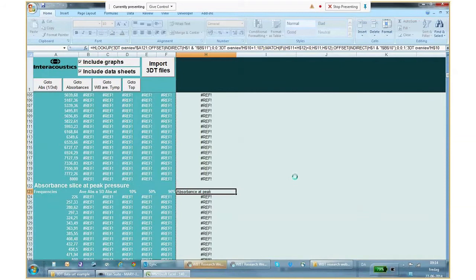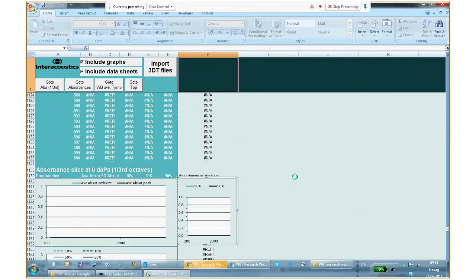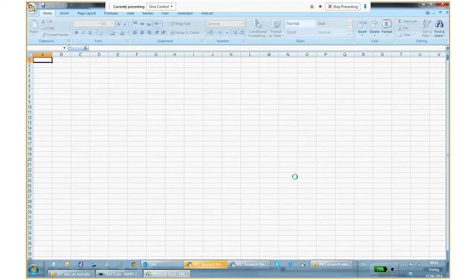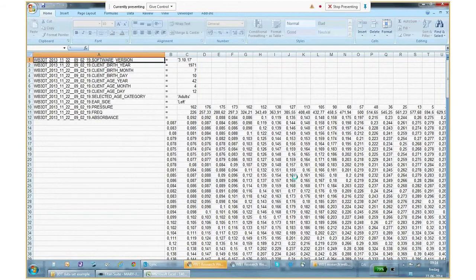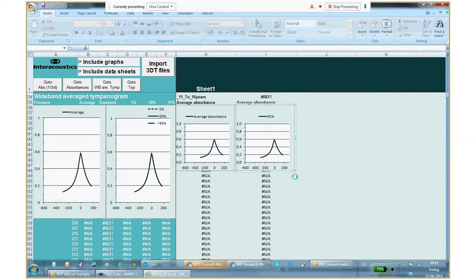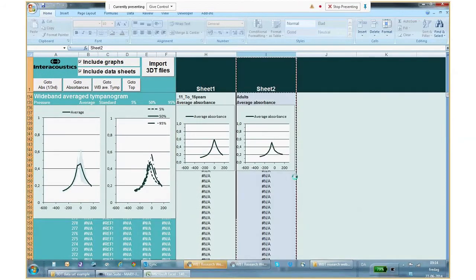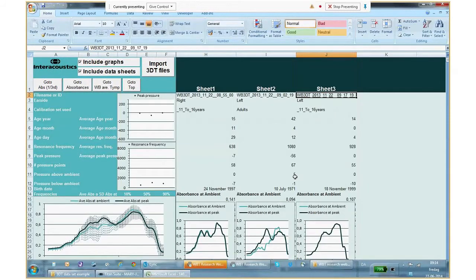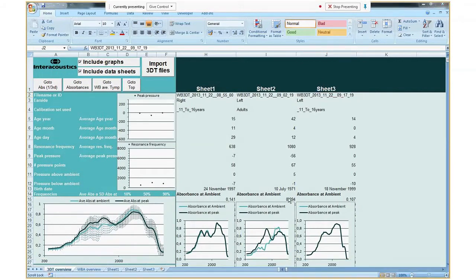It is also editing the data and then getting the data into the overview. So the screen is a little bit flashing back and forth. It's now busy with the second measurement, and now it starts importing the third measurement, handling the data, then copying some graphs. Okay, now we have imported 3 measurements in Excel.